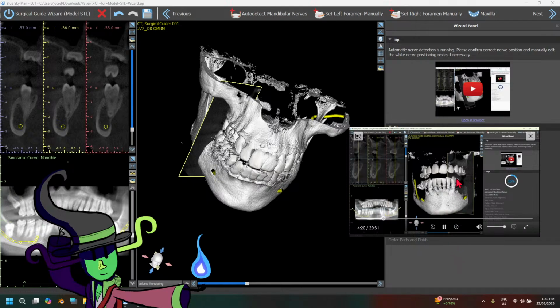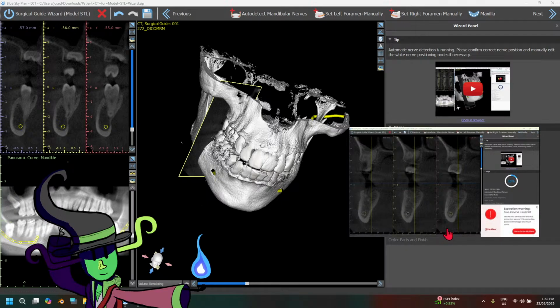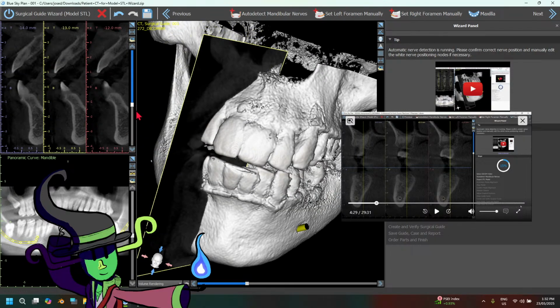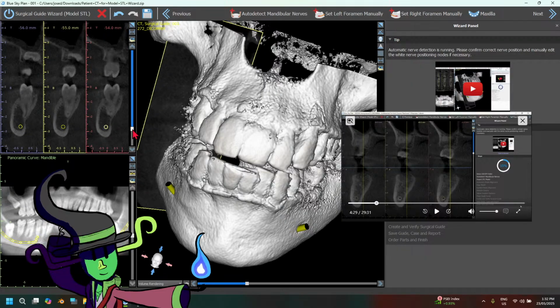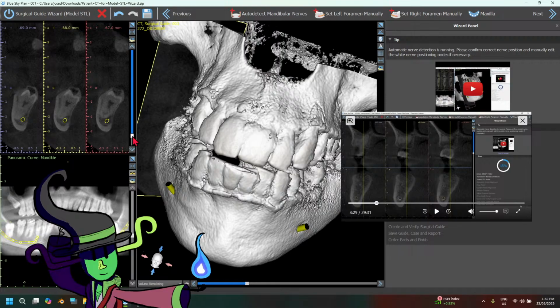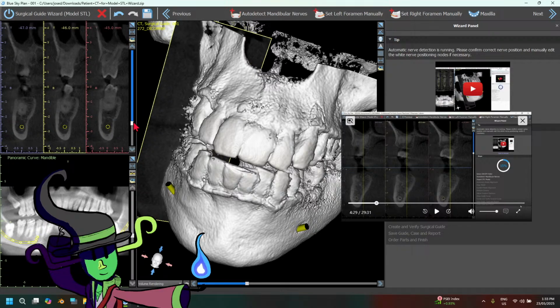There's a corner button you can click. But I wanted to point out that you can grab any of these little white nodes and reposition them. I know that you can do that, but I also know that I can drag these things over here in case it gets too in the way. I might just move this a little bit like this. And just like that.